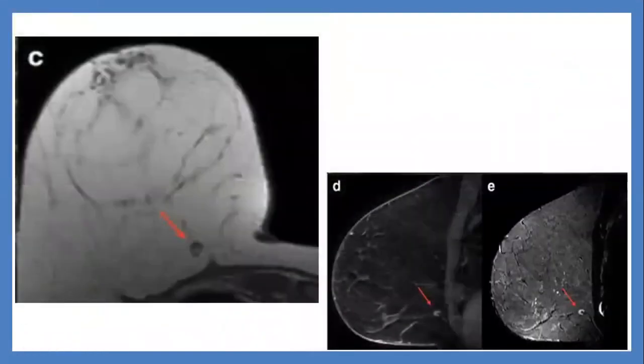Okay, what about MRI? We have seen it on mammography as a circumscribed mass, iso or slightly low density, with central lucency due to the fatty hilum and adjacent vessels, small, less than 1 centimeter, and commonly in the upper outer breast.